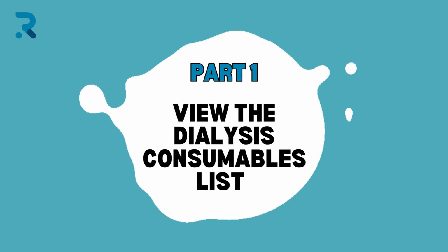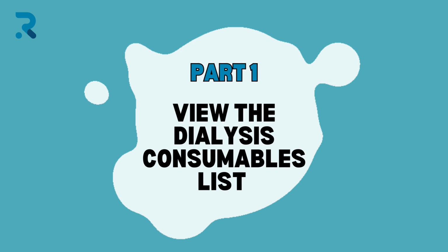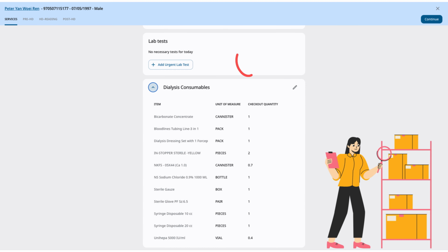Part 1. View the Dialysis Consumables list on HD Services page. The Dialysis Consumables list is a predefined list of items that are used during treatment for each patient according to the patient's access type, vascular or CVC. This feature allows the user to confirm the use of the consumable item directly during the HD treatment, and subsequently the item will be checked out from the inventory, reducing errors in inventory management.